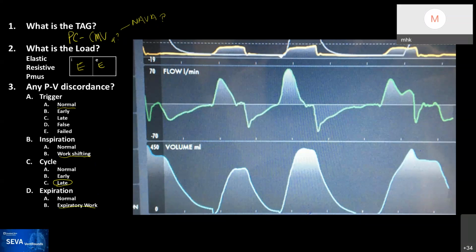This one is a hard one, my friend. So I'm gonna help you through it. But I really appreciate because you have a keen eye for detail, and that's what counts. So let me organize you a little bit. So without a doubt, this is pressure control, and the features that you have here is that the volume is not controlled through it, and there's this pause at the end, and the pressure seems to be controlled throughout the breath. So I completely agree with you.